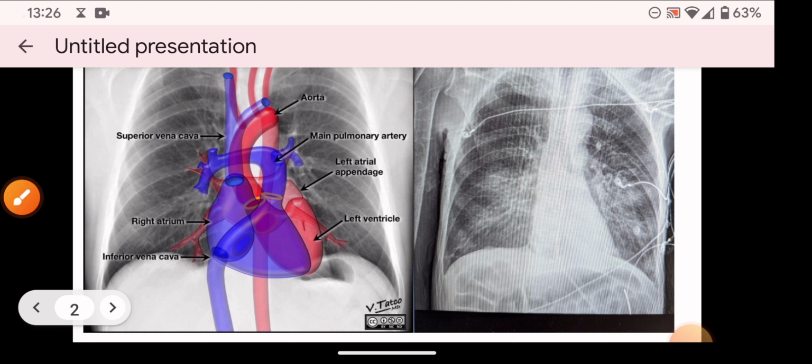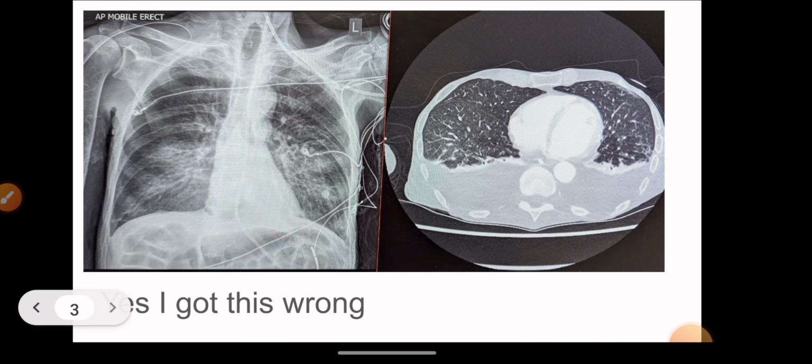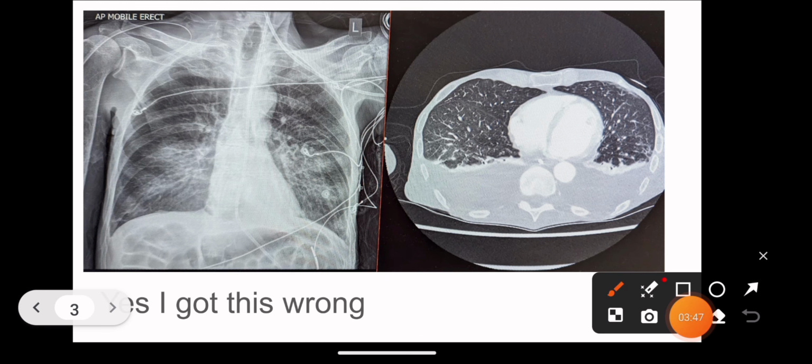So we go from there to, as I said, the donut of truth. And the donut of truth, this is just one slide from it, tells me that this man has significant pleural fluid. So we've got here what effectively is the edge of the lung, and then here's the inside of the rib cage, and where the lung comes to the inside of the rib cage up here, then that's good.